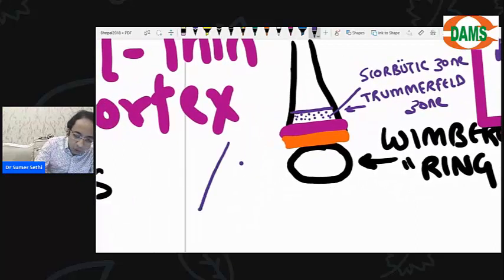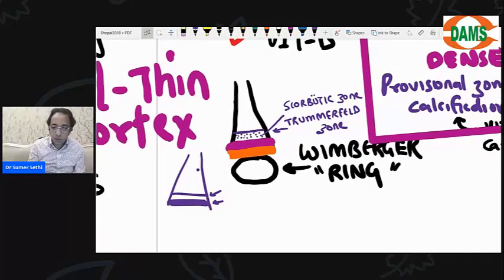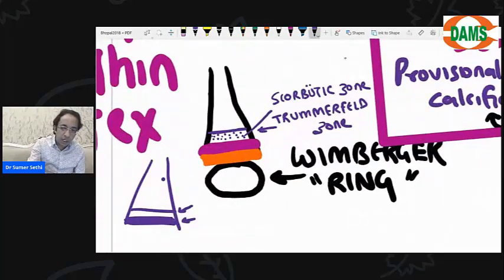The only thing that I want you to understand is स्कर्वी में मेटाफाइसिस पे एक तो व्हाइट लाइन दिखेगी और एक डार्क बैंड दिखेगा, एक डार्क एक व्हाइट. The white line, which is the white line of Frankel, represents a dense provisional zone of calcification. And after that, you have a darker area where the final mature bone is not being formed, which is called the scorbutic zone or Trummerfeld zone.